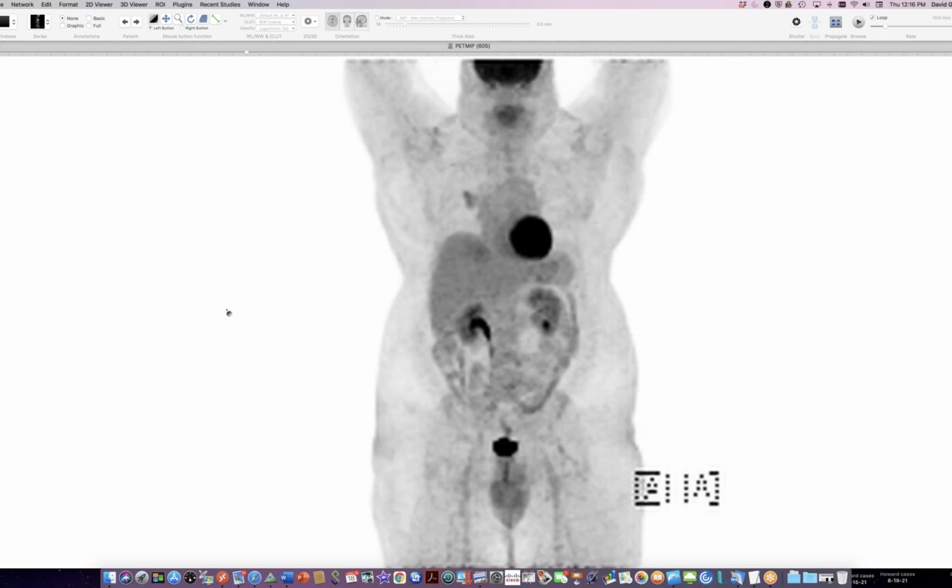But Jeff's case from a couple of weeks ago had a number of these very high attenuation mucus plugs. I just got one in this case, but this literally occurred within minutes of the webinar when Jeff showed that case. It's interesting. David, are there any airway abnormalities away from that one, separate from it in the lung? Not that I saw. Did you see something? Okay. No.